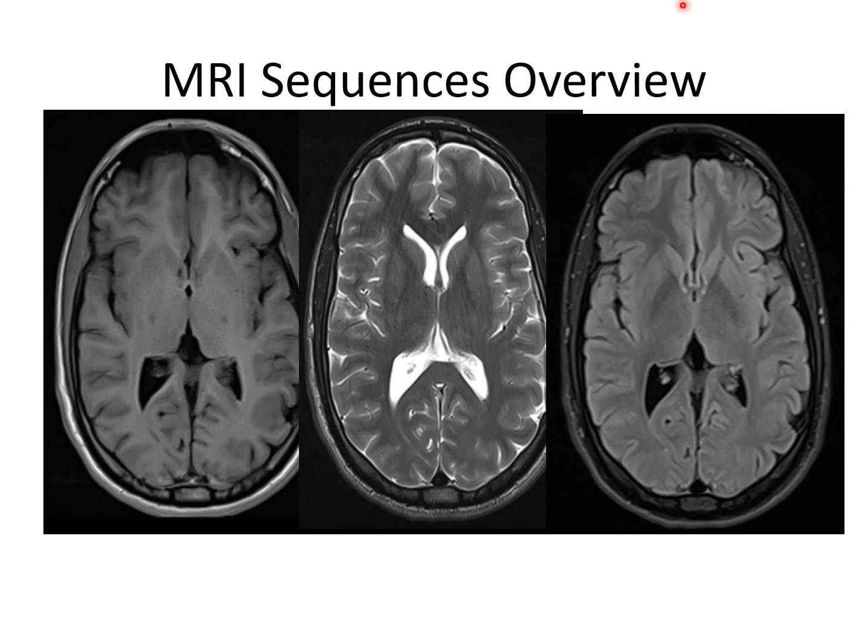And now the third one is the FLAIR. This is the sequence where CSF is suppressed. So we can see here also CSF is dark, but in this sequence white matter is also dark. In T1 and FLAIR, CSF is dark, but in FLAIR white matter is also dark, but in T1 it is bright. So this is good for parenchymal lesions and edema.